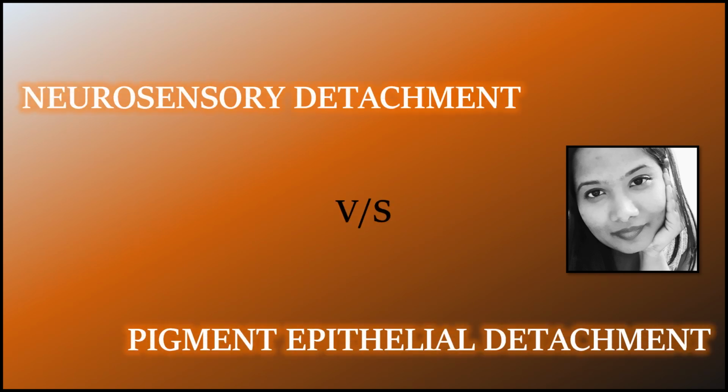Hi everyone, I'm Dr. Babita, and in today's short video, we will understand how to differentiate between a neurosensory detachment and a pigment epithelial detachment on OCT.